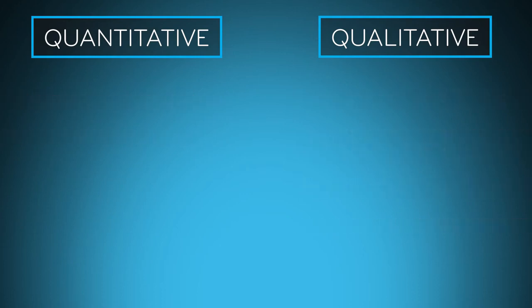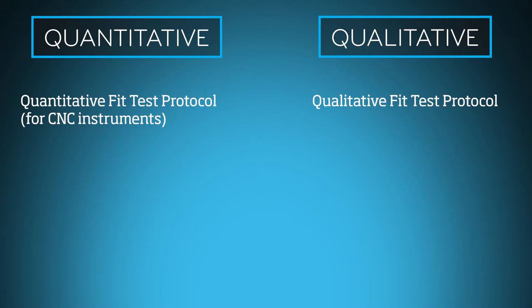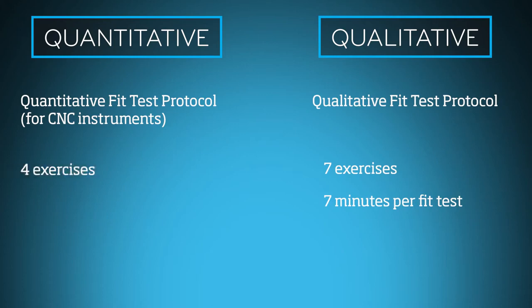The two testing methods we are comparing use different OSHA protocols. The qualitative fit testing protocol requires 7 60-second exercises, totaling 7 minutes. The quantitative protocol used by PortaCount instruments requires only 4 exercises of varying length, totaling 2 minutes and 29 seconds. Let's see how these two fit testing methods compare.